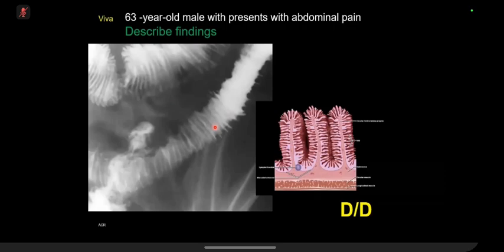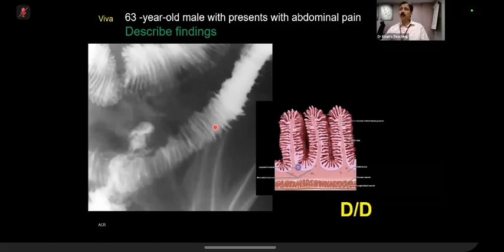Okay, there is spiking from the mucosa, and there is pooling of contrast, like there is a fistulous tract. I couldn't identify this bowel loop. However, there is thickening and there is spiking with a thumbprinting appearance. Excellent. Well, thank you very much, number 11.